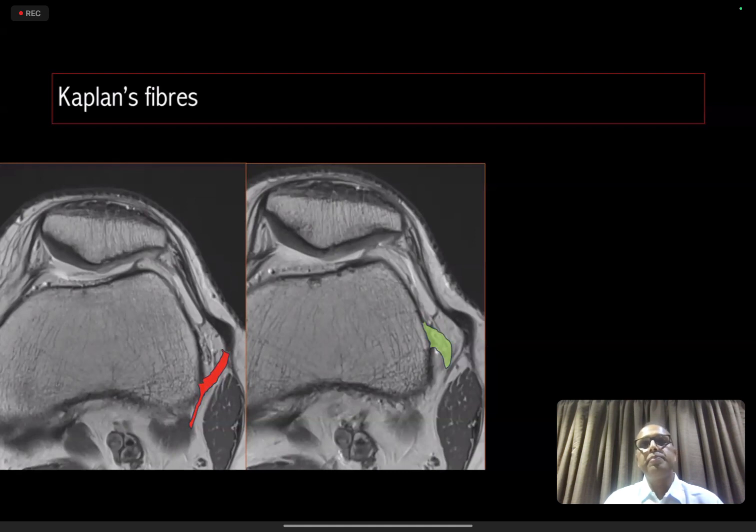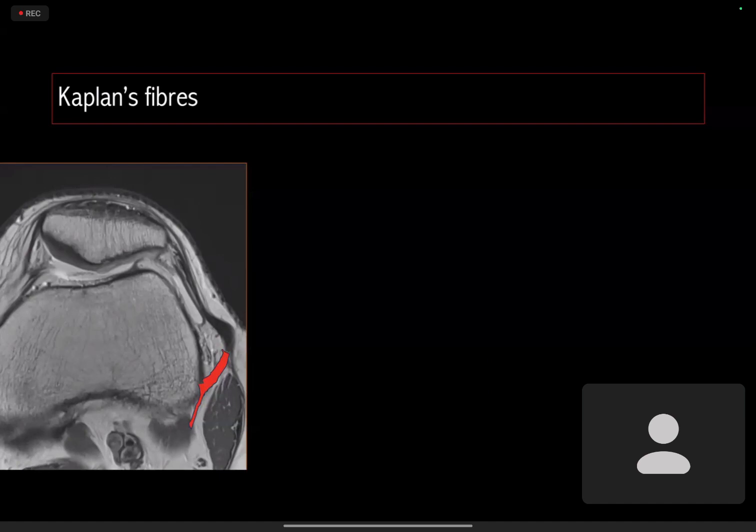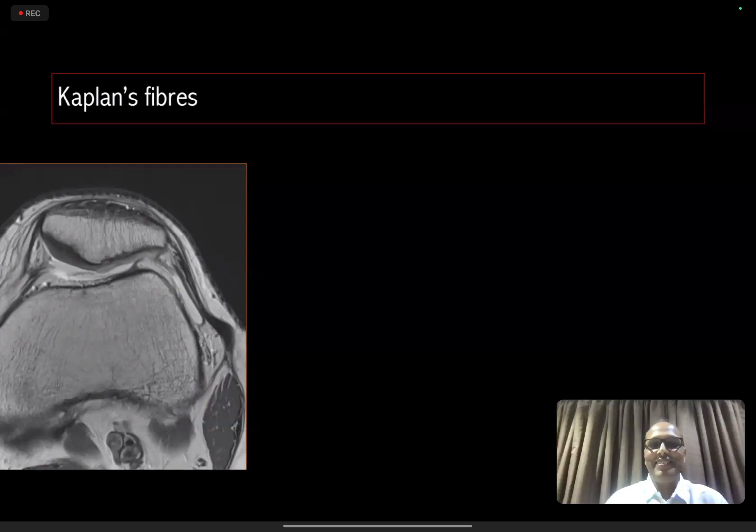Yes, sir. Thank you. The last question is, how do you differentiate ACL tear versus mucoid degeneration, and which sequence and plane would be ideal? The question is about the mucoid degeneration here.